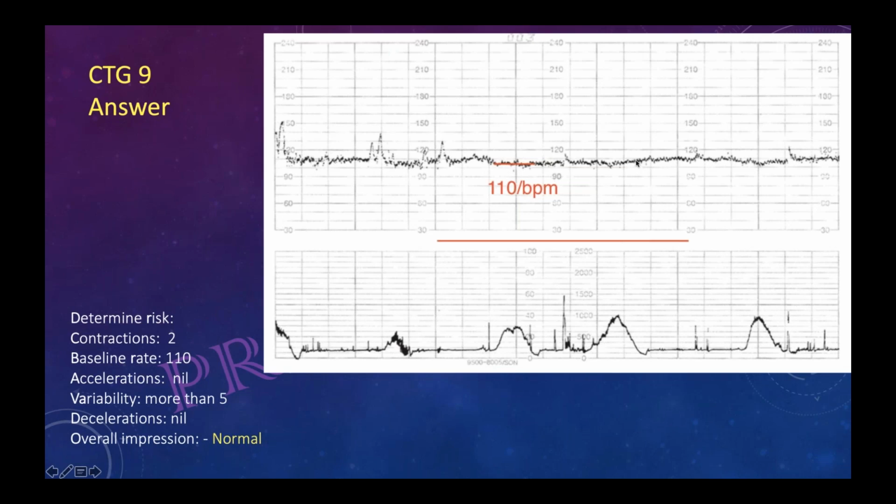In the one where you are putting the arrow, I think there is one box. Yes, it is one box. I think this is 10 minutes, so calculate here, and the duration of the CTG is also mentioned. It has to be half a box; if it is more than half a box, then it is normal.